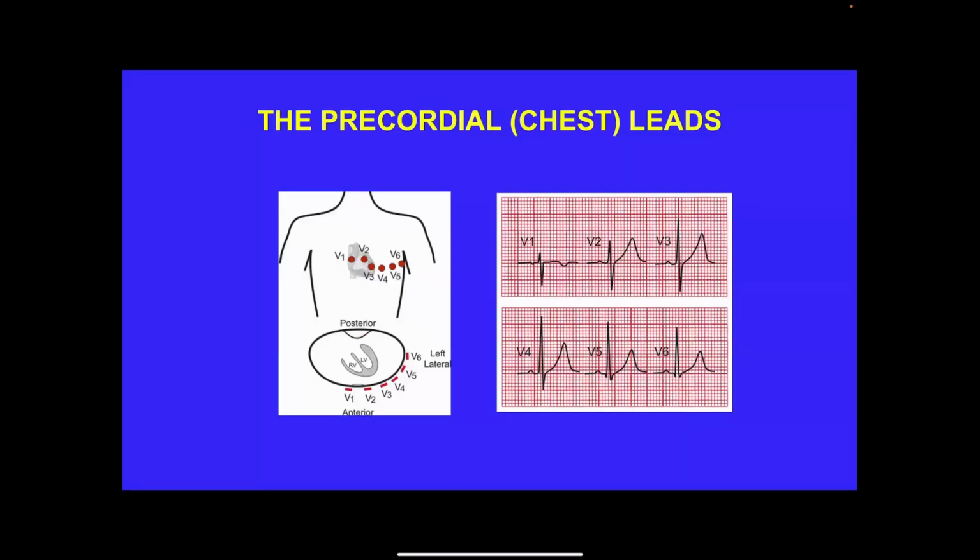Now, these precordial chest leads, I want you to be familiar with how the normal looks like, okay? So that you're able to tell how the abnormal looks like, you know? So just be familiar with how it is. If you want to keep a screenshot, so when you're solving, you're able to compare and stuff like that. Just be familiar with how the normal looks like. And if you can see, they don't really look like your typical wave, you know what I mean? Like the one in lead 1 and lead 2 and stuff like that. But just keep in mind.